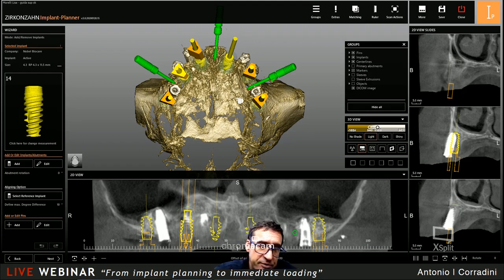Not just the guide, but you can use this position of the pin and match the pin also to the prototype, just to be easy. I will show you later that we can use these pins also directly on the surface of the prototype, just to be able to find the position and the vertical dimension really easily.